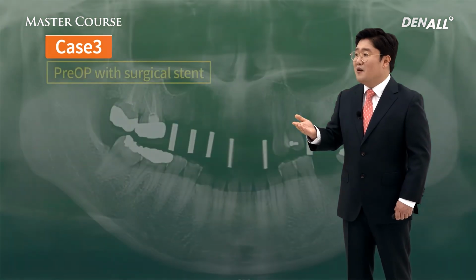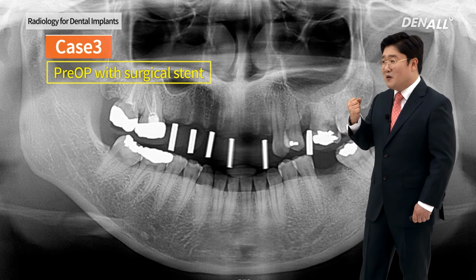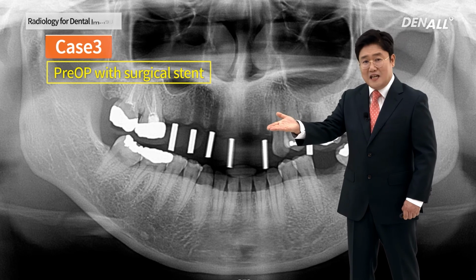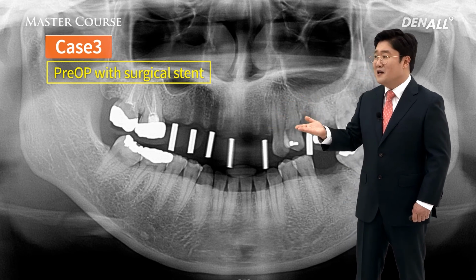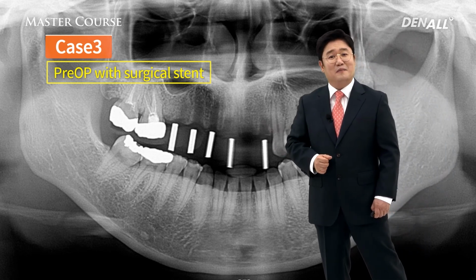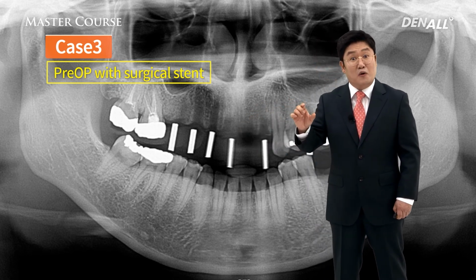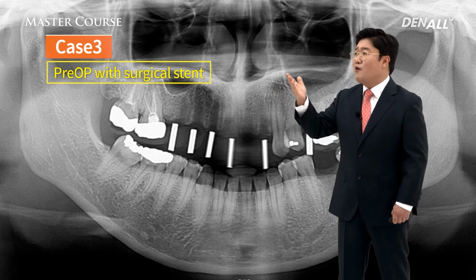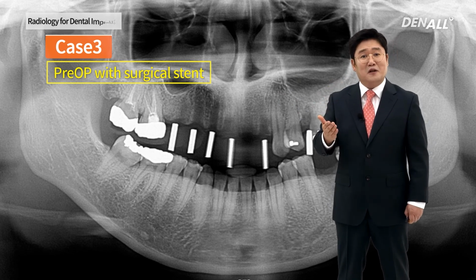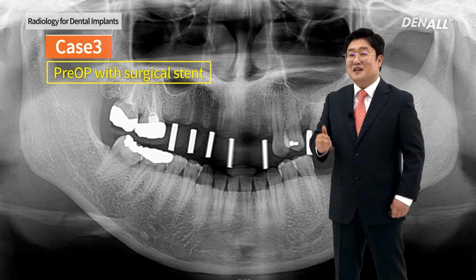After that, the radiologic template or stent or guide is removed, and it is delivered to the patient's mouth, and panorama is taken. You can see metal rods. Implants will be placed in those locations. The metal rods, we know their length accurately. Therefore, the degree of distortion, the vertical magnification, can be exactly identified. Therefore, implant diameter and length would be chosen.